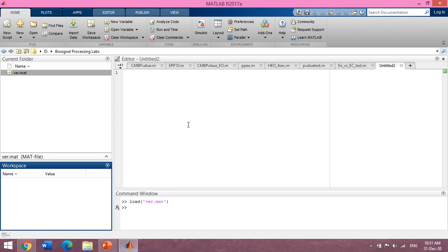Now this is the second part of recorded lab session 4, in which you will see how we implement ensemble average in MATLAB. With reference to the first lab activity, we are supposed to take the ensemble average of 100 responses of visual evoked potentials. Remember, visual evoked response is an EEG signal which is recorded near the visual cortex.